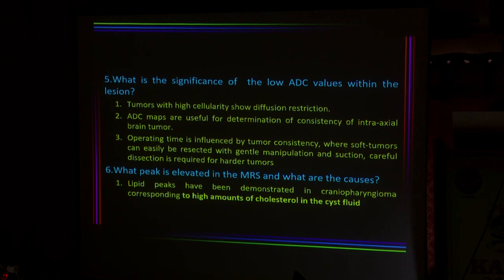What does the low ADC value within the lesion reflect? Generally in brain tumors, you must remember that the ADC values reflect the friability of the lesion. Tumors with high cellularity may show restricted diffusion. These are not friable, very difficult to crack open, and the consistency can be assessed with the ADC. Based on the tumor consistency, the operating time is influenced. Friable tumors can be easily resected, while the harder tumors need careful dissection.